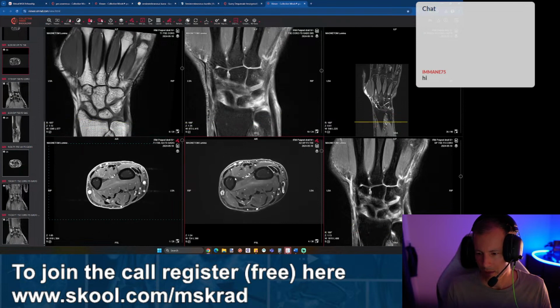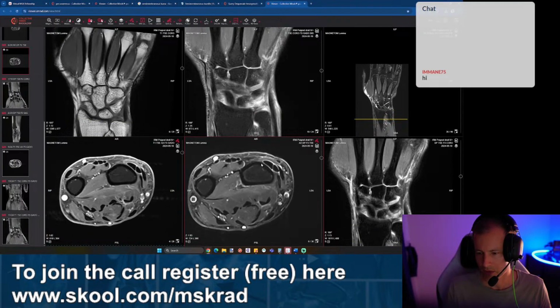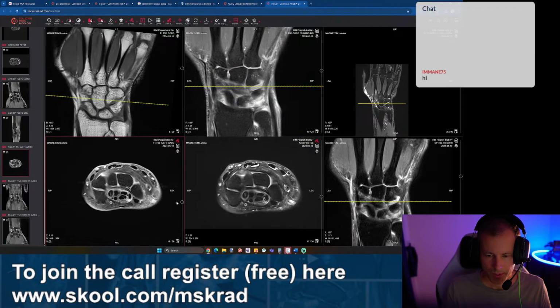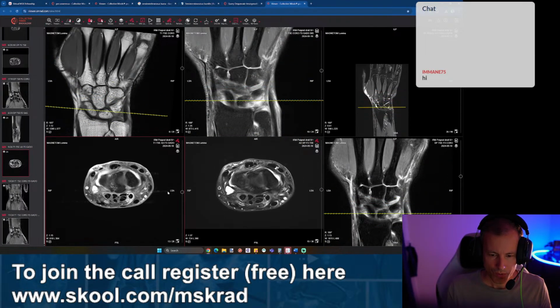EPL, or at the proximal intersection here, we don't see specifically an irritation of the first extensor compartment. EPL comes over distal intersection. I don't see a separate, focal inflammation there, which would indicate a mechanical issue. So yeah, we've got tenosynovitis at different locations.